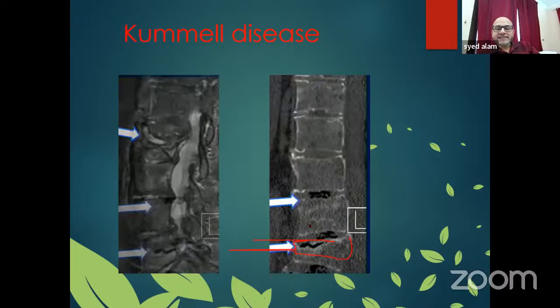Osteonecrosis has two findings. Either air will be within the vertebral body. Disc air is degeneration, not a problem at all. We call it the vacuum sign. But within the vertebral body where a fracture happened, after the fracture, necrosis will happen in that area. So either fluid or air accumulates. It will convert to necrosis and air. So don't worry about that air. This is benign air. This is not a problem. So we call it osteoporotic compression fracture with osteonecrosis.